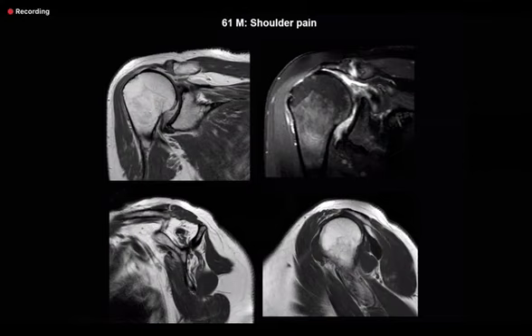So I'm looking specifically at the insertion point of the supraspinatus, because this is suggestive of a full thickness tear. On the first image on the top left, I can see there is a full thickness tear of the supraspinatus with a big gap. So overall finding is in keeping with a supraspinatus tear with subsequent muscle atrophy. Okay.